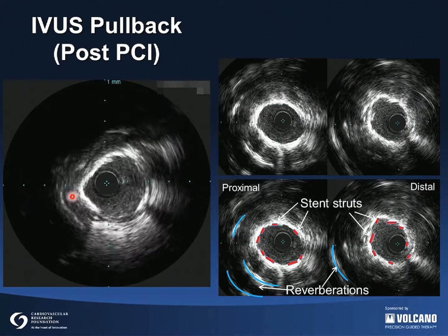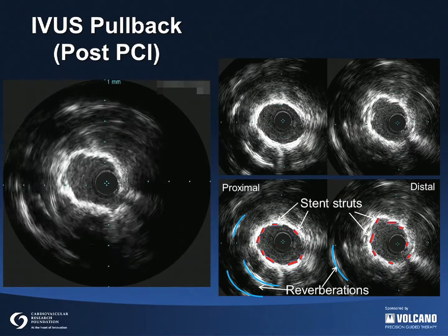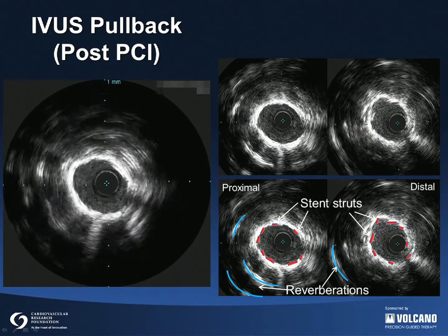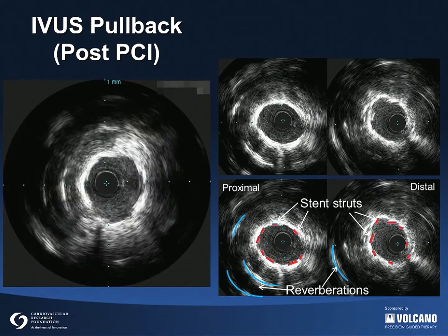Note that the reverberations shown by blue lines are still present, and that it can be difficult to differentiate the metallic stent struts shown as red dots from the calcium to which the struts are opposed.